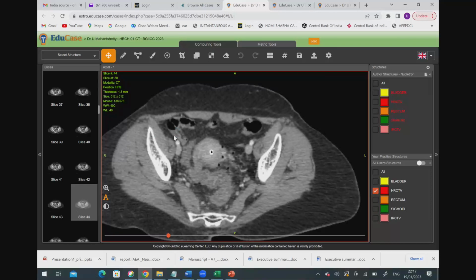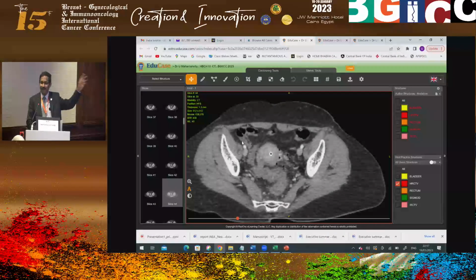So first practical tip is go to a slice where everything is clear to you. So recollect, NMD was 2.5 on the left, 1.5 on the right, width was 4 centimeters, disease at cervix, and minimal parametrium on the left, right? And you had normal cervix, even at diagnosis on MRI. So in my mind, I am trying to identify where will be my height superiorly, where will be my inferior border, and parametrium. Okay, vagina was not involved, so I stop at cervix.